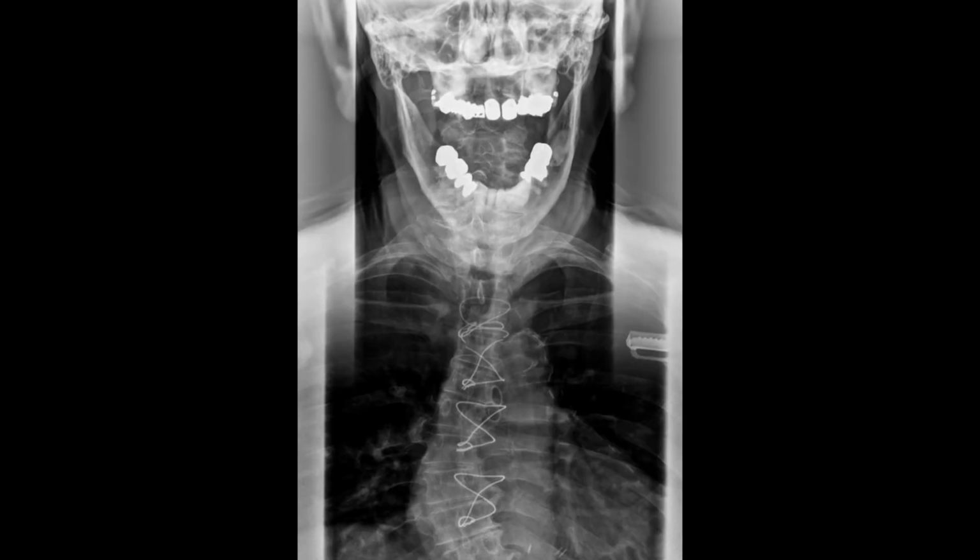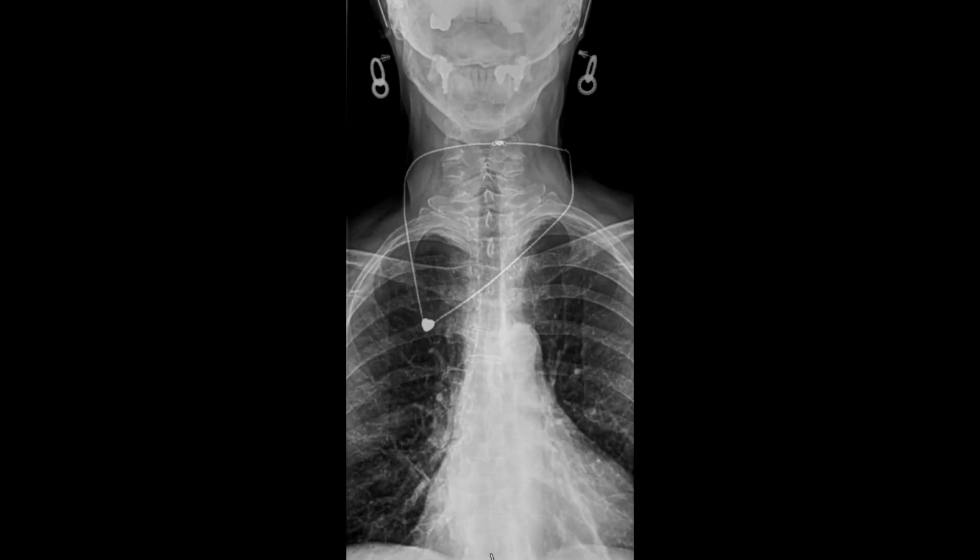Imagine trying to rule out osseous pathology of the cervical spine and having this as your frontal view. The overlapping teeth, mandible, occiput really obscures assessment of the cervical spine. So while it may look good from a postural perspective, being able to see that scoliosis in the thoracic spine, it gives no information about the cervical spine. On this view, nothing is really seen well. The upper cervical spine isn't factored appropriately, nor is the thoracic spine. So only the lower cervical spine is really visualized well.